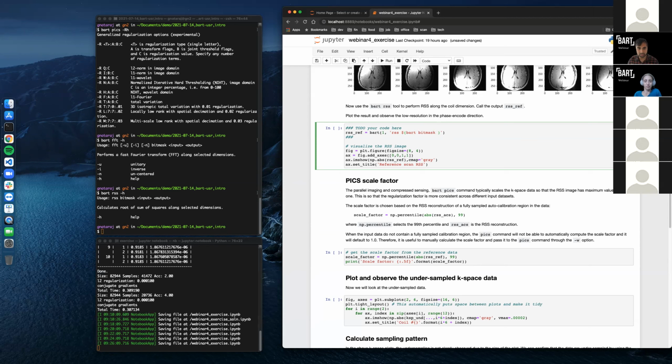Along which dimension are we doing root sum of squares? Actually, is it 3? That's right. All right. I'm glad you asked because I put in, and then, what's our input? Our input is, so we're doing the ref. So there'd be case-based ref, KSB ref, I think, or not.